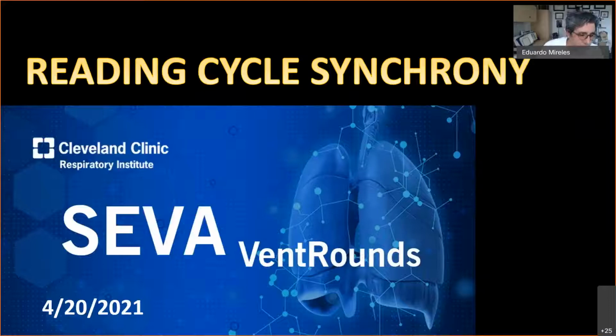It's April 20th, 2021, and this is live SEVA VentRounds. Today we're going to focus on reading cycle synchrony. We'll do the usual read, but I thought it would be good to talk a little bit about cycling on mechanical ventilation.